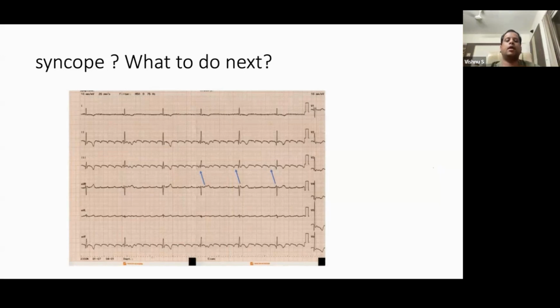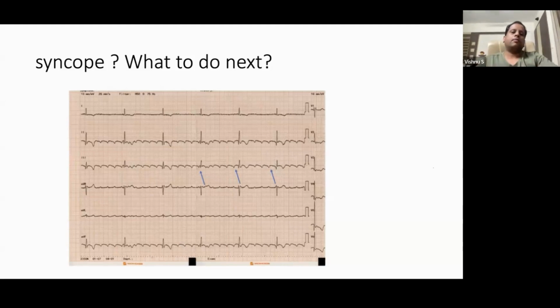This is a combination, and to very brilliant eyes it will be visible. There is a subtle arrhythmia. You can diagnose these things because atrial flutter is going on. And below that atrial flutter, is anything else found on comparing the P to the QRS relation?